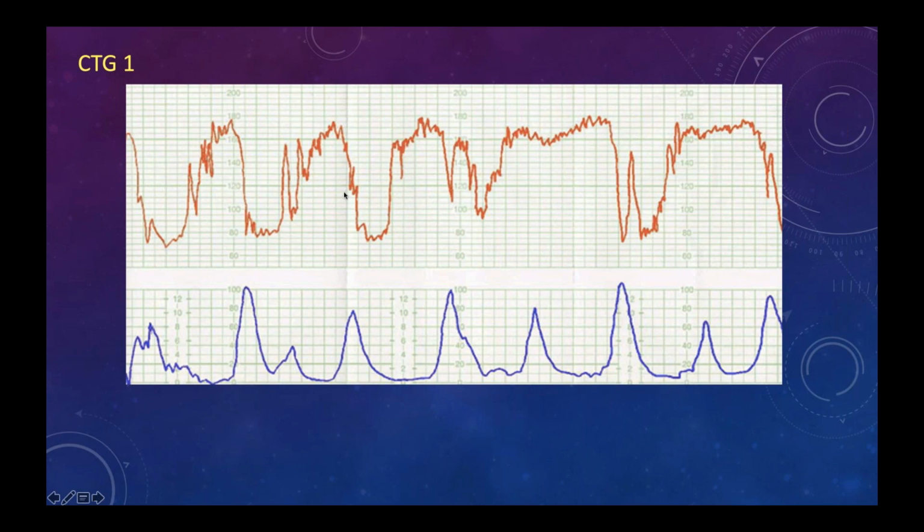So you have got variable decelerations. The W shape is also there. Shouldering is present in a few decelerations, and in a few we cannot see it, so we can say loss of shouldering. You have already got two features. These are variable decelerations with concerning features.